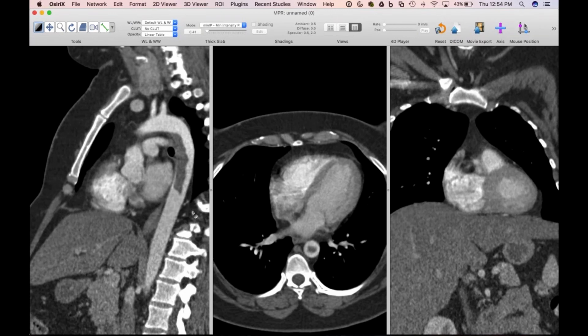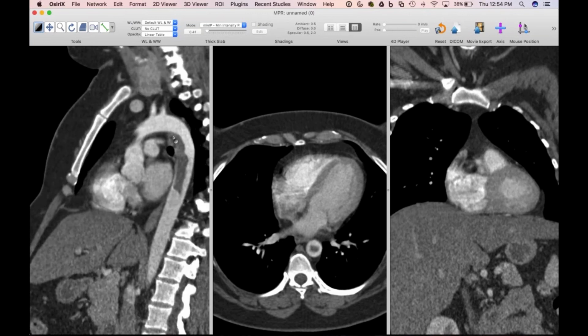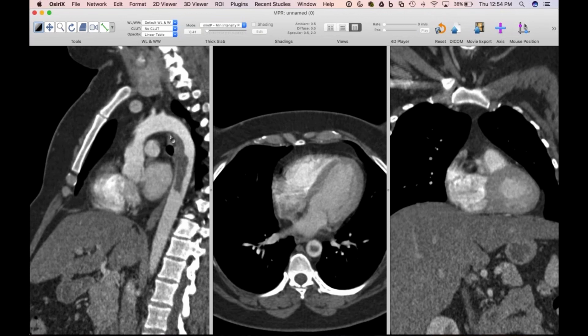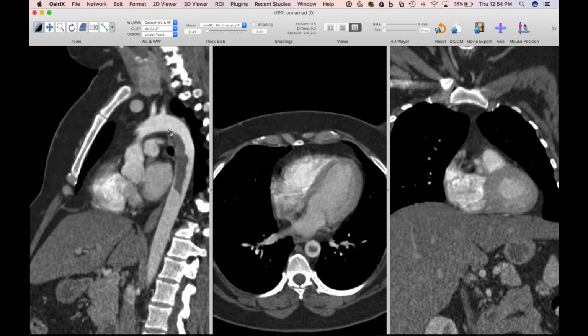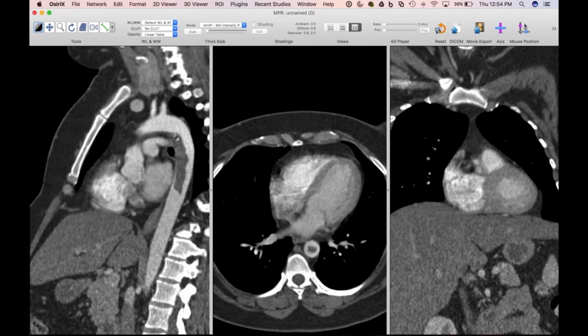So this was the largest mobile aortic thrombus I'd seen, but I think this flow pattern kind of describes maybe why it forms along the undersurface here. And this is also where you usually see atherosclerotic calcification first in the aortas, near the isthmus here. So I don't know if that's related too, but I know one of my attendings in residency was always suspicious of that.